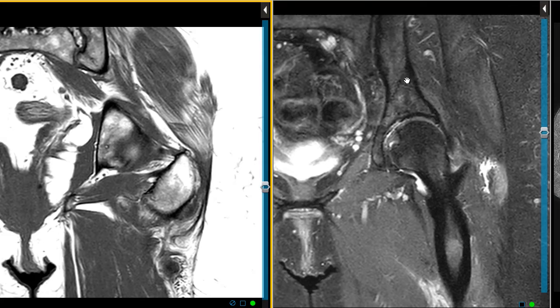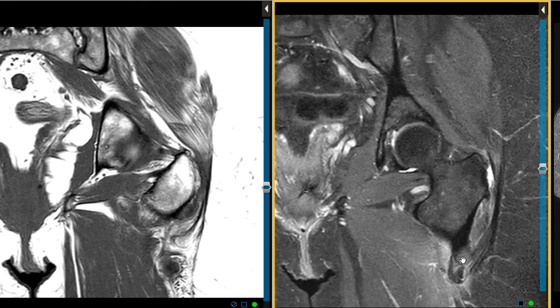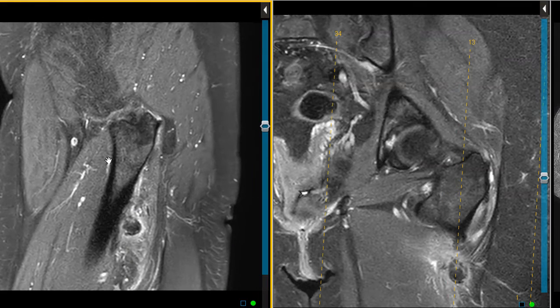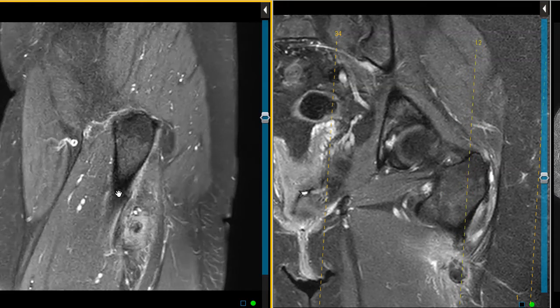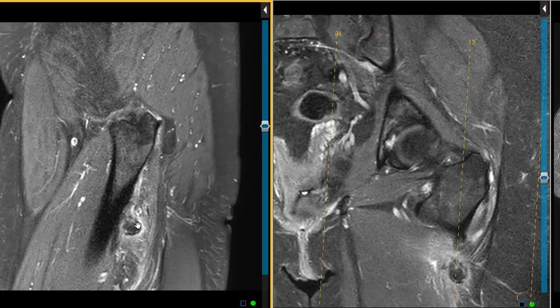So we're going to put up a sagittal view to look at this better. Here's a coronal view that shows that little unusual area of darkness. Here we go. So here is the sagittal view. Here's the front, back. This is the femur. We see the cortex. The periosteum covers that, and right behind the periosteum we have this round ball. And it's right at that gluteus maximus attachment.